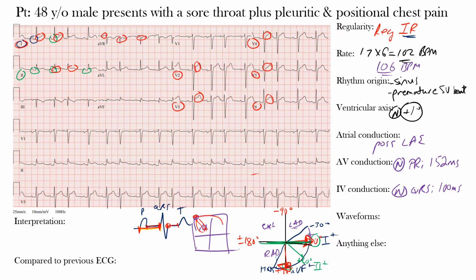So overall, the major waveform issues that we have now noted are this diffuse PR depression and ST elevation, along with PR elevation and ST depression in lead AVR. In addition, we noted that slightly prolonged QTc interval. So let's just add some of these here. The first thing we noted was that pretty diffuse PR depression and ST elevation. Not seen in every lead, but you can see them quite a bit, especially the ST concave morphology that we saw in those precordial leads V2 through V6.